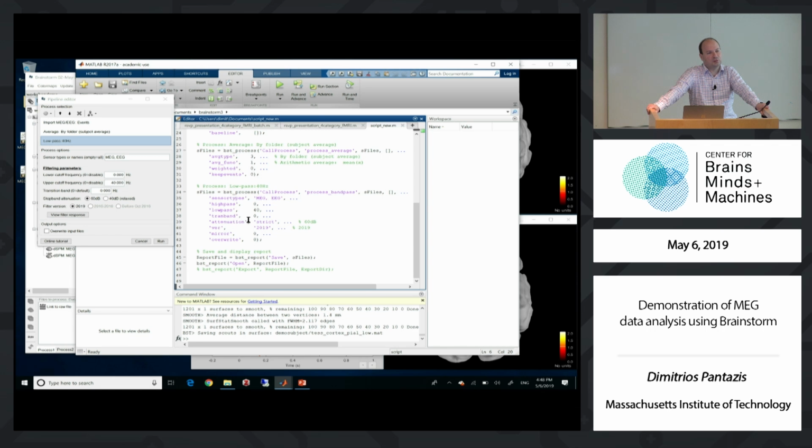SPM has a good connection with fMRI. Possibly, if you want to do common projects, it would be beneficial to combine both. They also have some ways of integrating fMRI solutions with MEG, bias one solution to another one. FieldTrip, another major software, has excellent time frequency routines. Really, really excellent implementations of these.